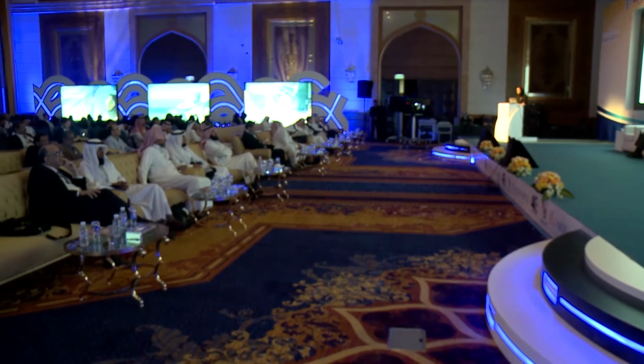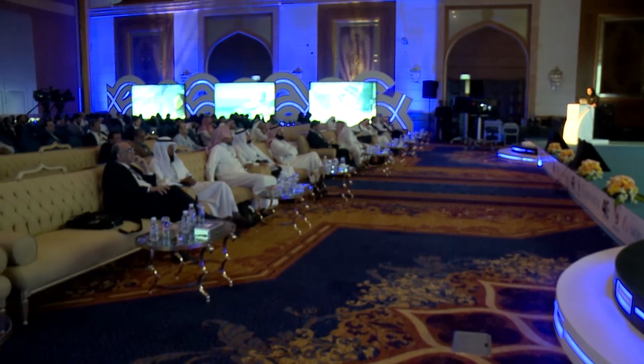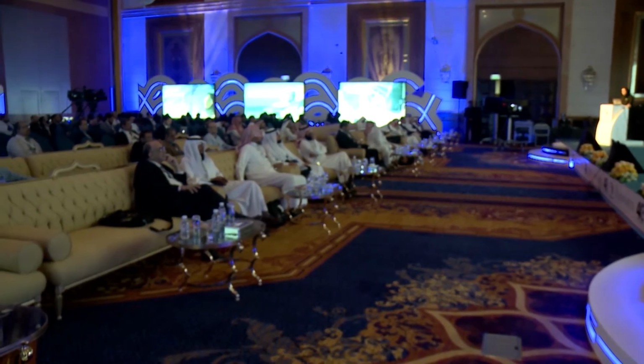Argus II has two components, internal and external. The internal component is the Argus implant, the electrical stimulation device that is implanted in the patient's eye, along with a radio frequency coil and a case. The coil and case are stabilized around the eye globe using a scleral band and suture, and the thin-film electrode array is tacked onto the retinal surface at the macula. The external part is the Argus glasses, specially fitted with a video camera, the radio frequency coil, and associated electronic circuitry. The glasses transmit electrical stimulation data along with power wirelessly to the implant.